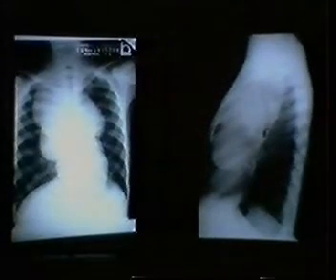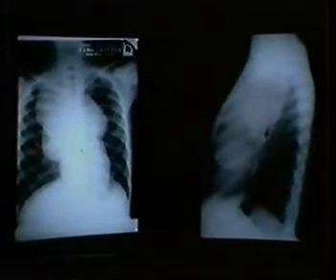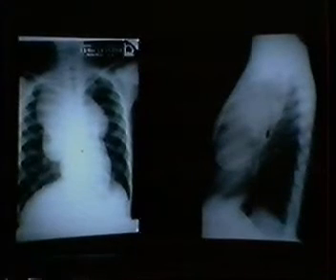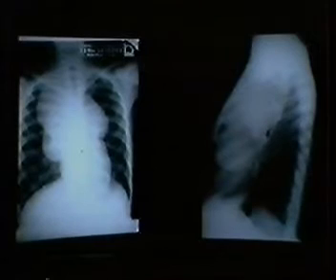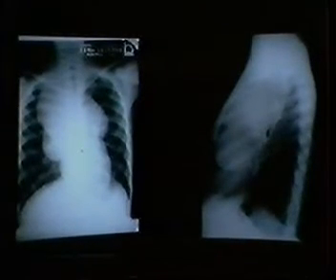Alternatively, this would be a very typical appearance of nodular sclerosing Hodgkin disease, a large multilobular anterior mediastinal mass in a young patient. Lymphoma tends to have two age peaks for when it occurs, one in the younger population, say teens, and then another peak later on in, say, the 50s or 60s.